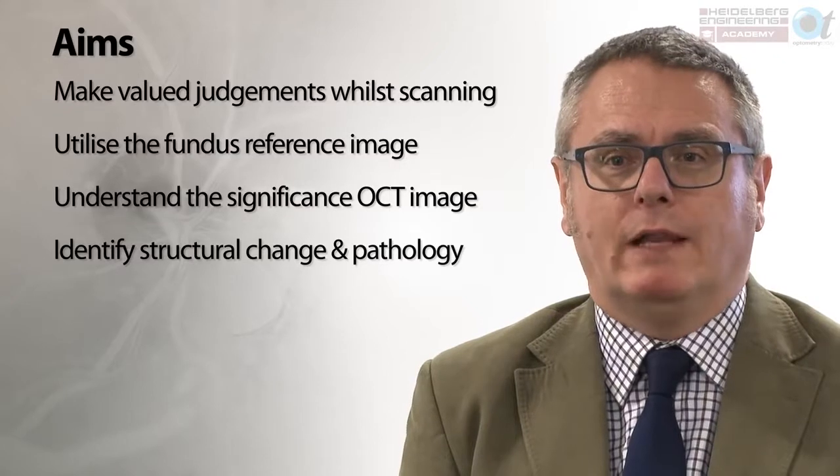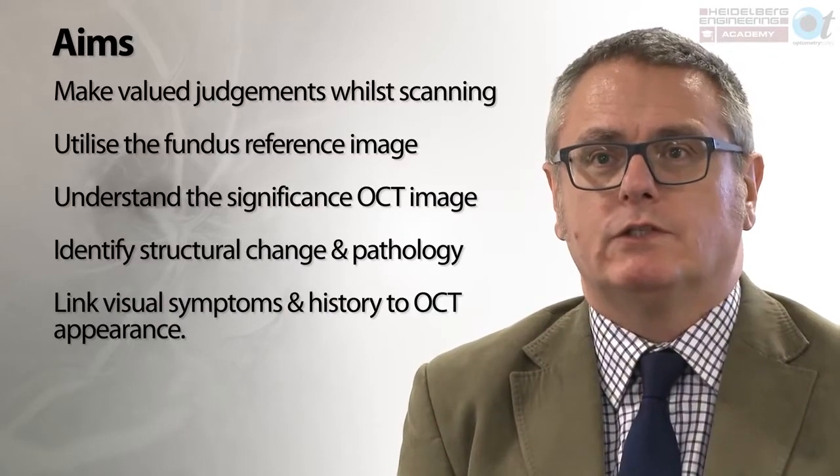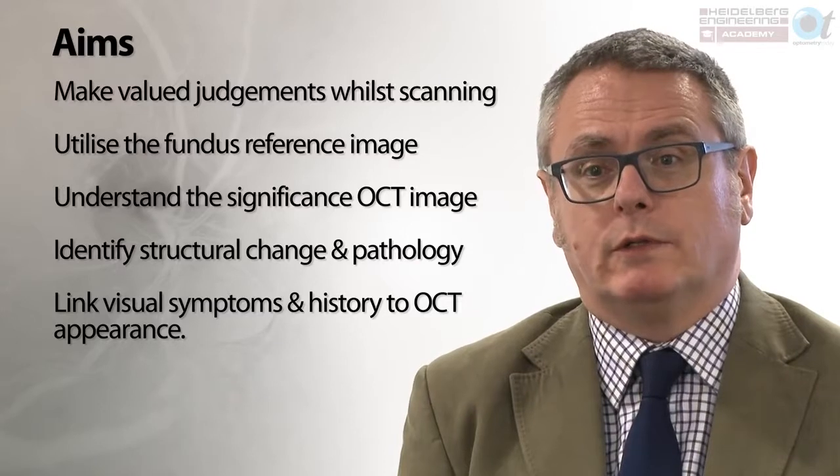Today I'd like to talk to you about interpretation and terminology for OCT images in the application of retina. What I'd like you to take away from this presentation is the ability to make value judgments whilst you're scanning the eye. The process of interpretation starts at the point of image acquisition and making value judgments so that you modify or change your scan protocols.